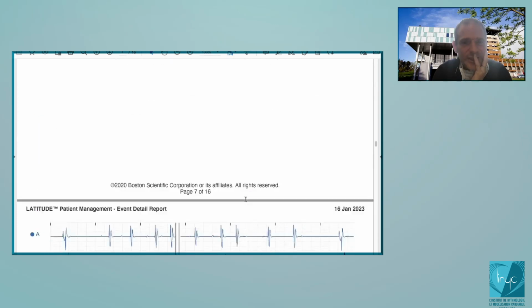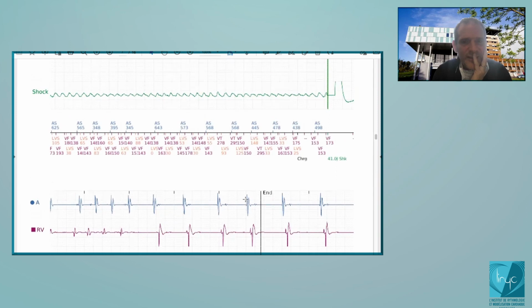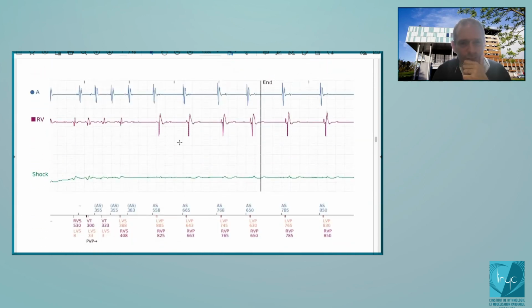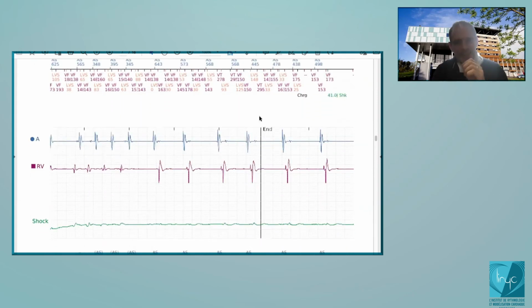If you consider this arrhythmia here, you see this episode, there is a shock. At this time, the shock has been efficient. So there was an arrhythmia, ventricular fibrillation, and a shock. You need to understand what it means to define that this is the end of the episode.